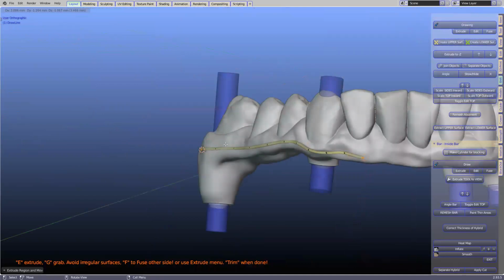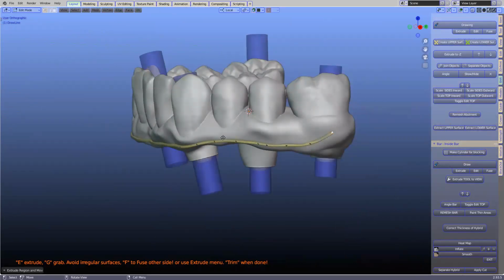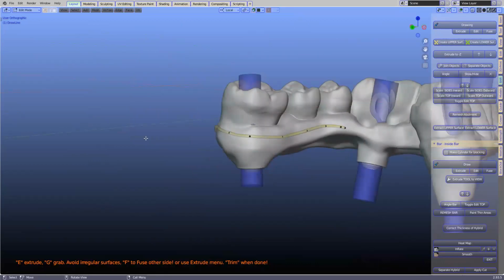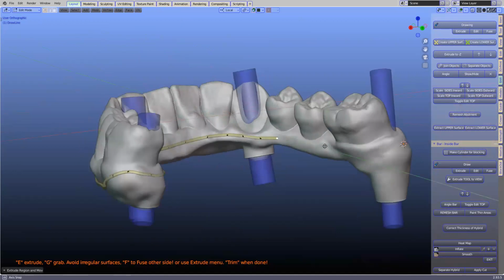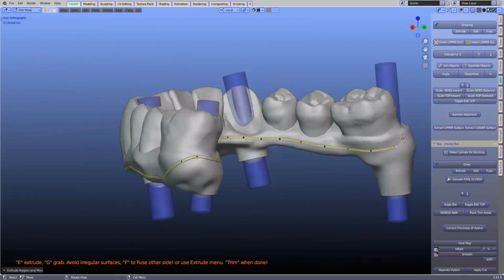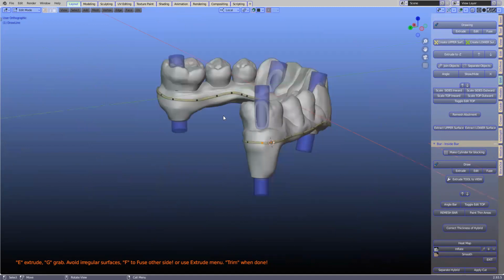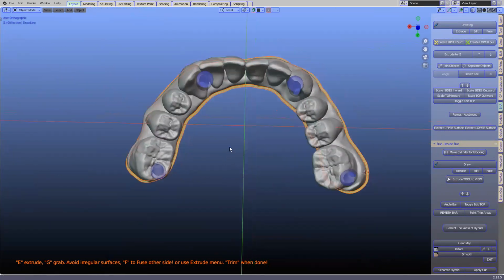I'd love to see another CAD program being able to do something like this. It is a tricky situation. It is not an easy thing to do. And of course, if this were made on its own, you'd probably need quite a resilient material because it is so thin. So including a bit of maybe titanium. Imagine doing the lower piece in titanium, lightweight, biocompatible. Maybe even anodized, you can do that, in pink or something beautiful. Can you imagine that? Wow.